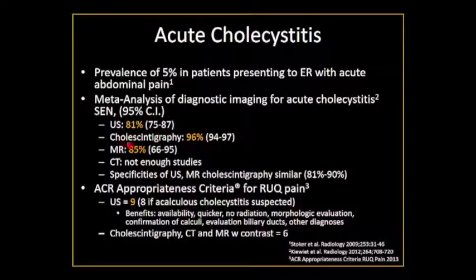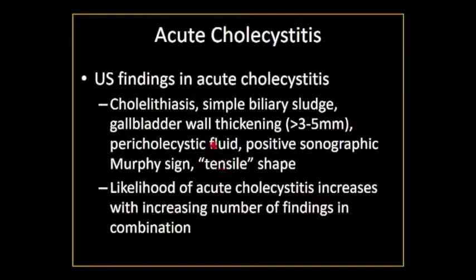That's what puts ultrasound, certainly in terms of no ionizing radiation and ease of ability to order the study, high on the list. But remember that number, and let's see if we can improve our diagnosis and make that higher in our own practices. Acute cholecystitis has a whole lot of findings, and the more findings you have, the more confident you will be about the diagnosis, because gallstones alone certainly do not make that diagnosis.